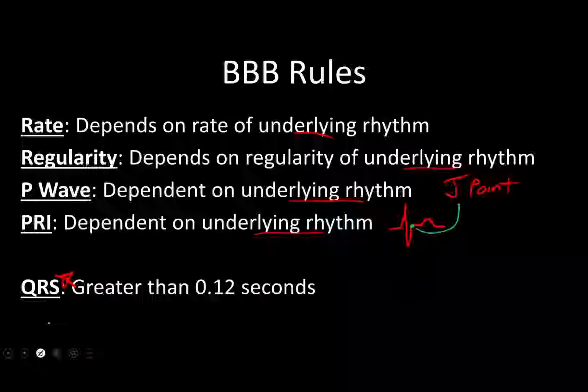That's all well and good, but reality will show you in time that it doesn't always work out that well. And especially when you have bundle branch block patients, what you may often see is isoelectric, R wave comes down, your S wave then goes something like this, where you don't have that nice clean horizontal shelf to tell where the S wave ends and where the T wave begins.